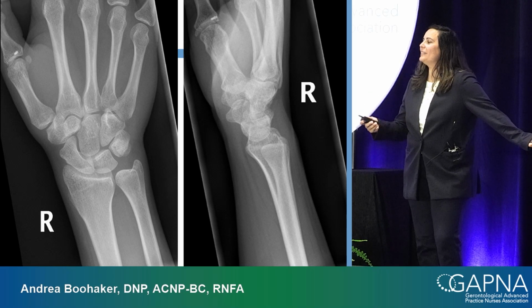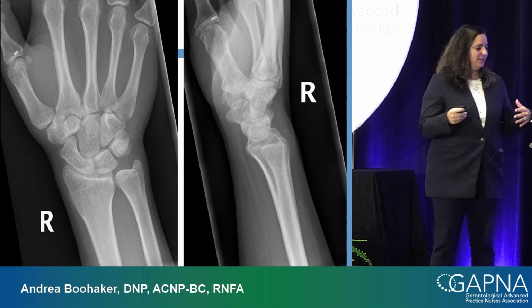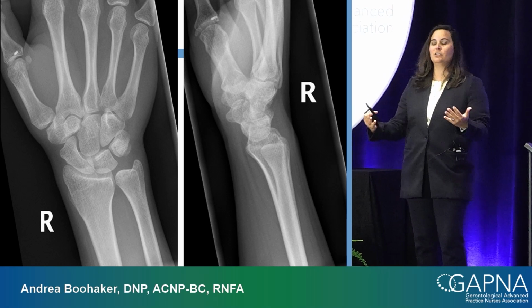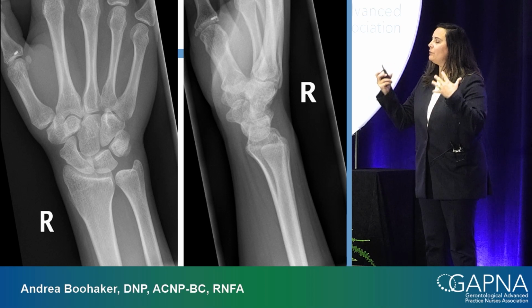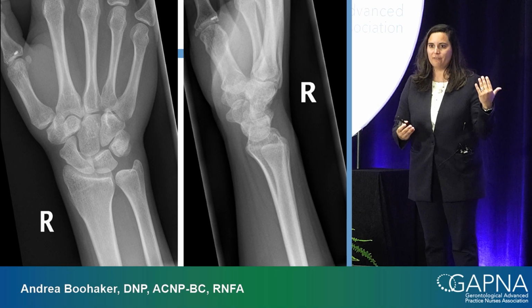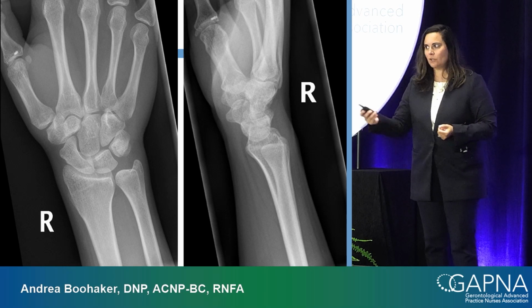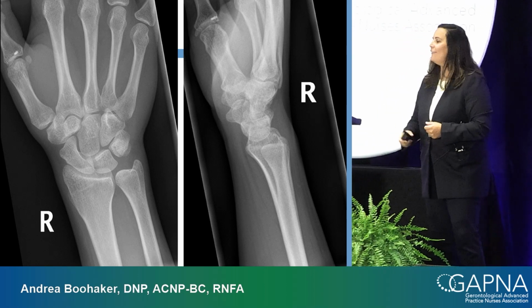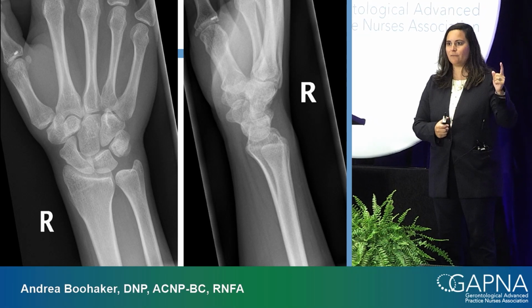The purpose of throwing this up there is multifaceted, okay? When you're looking at an x-ray and you have to relay back to your attending or to whoever you're calling consult for, you have to be able to explain the x-ray in a way where they have no screen in front of them and they can understand exactly what you're saying. Okay? So let me show you how you do it. This is an AP unilateral of a skeletally mature individual. Okay? That's the first thing.